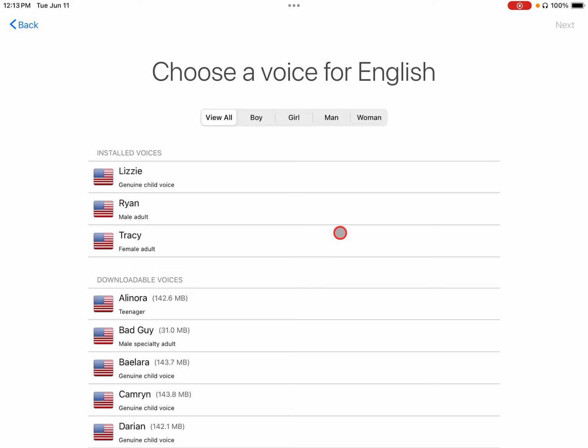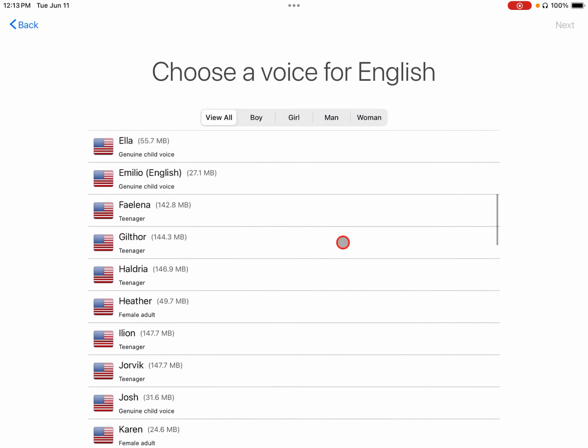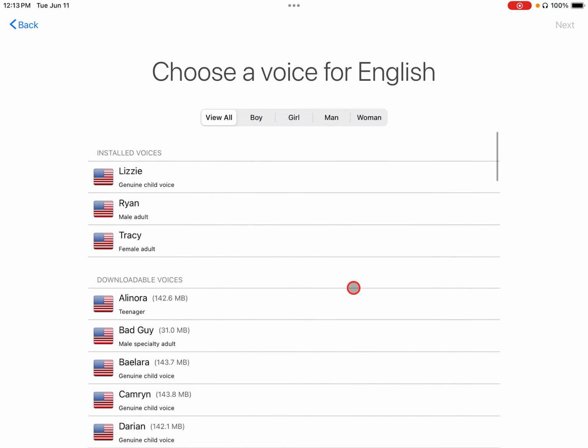So these are the voices that are already installed onto the device. If you scroll down, there are many more voices to choose from that simply need to be installed. So for today, we are going to start off with Lizzie.